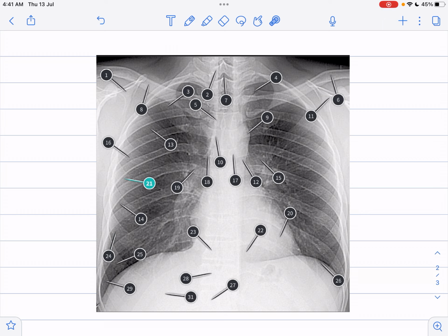All right, so next, this is the costocardiac angle, the costodiaphragmatic angle. All right, so here you guys can see ribs as well, very important. I'm emphasizing it again and again. These are very important. You guys should know how to count these, just follow the markings, very simple. These are the ribs. Okay, next.